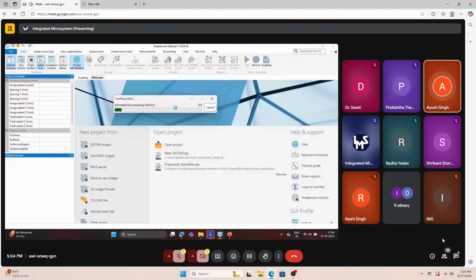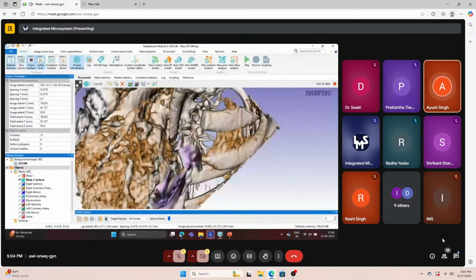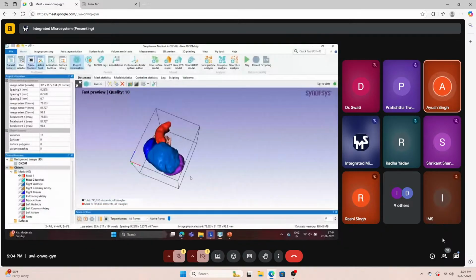But some parts were missing in the automatic segmentation, so the ultimate model was obtained in around 15 to 20 minutes. Since it was a 4D CT data set, we can also have a frame by frame visualization to mimic the beating of the heart over here.